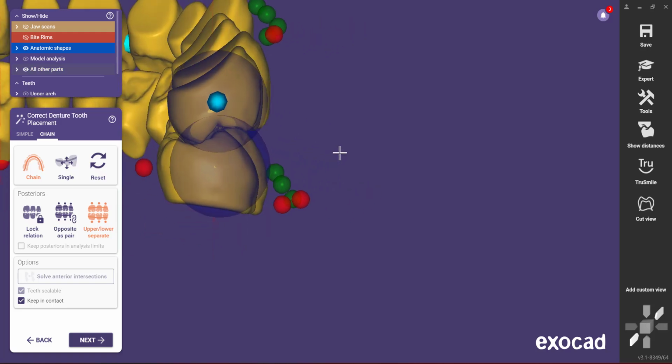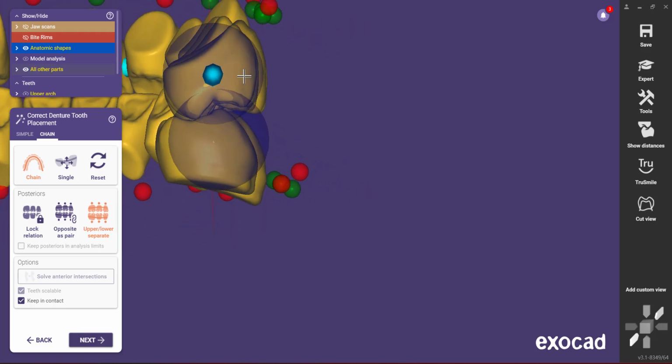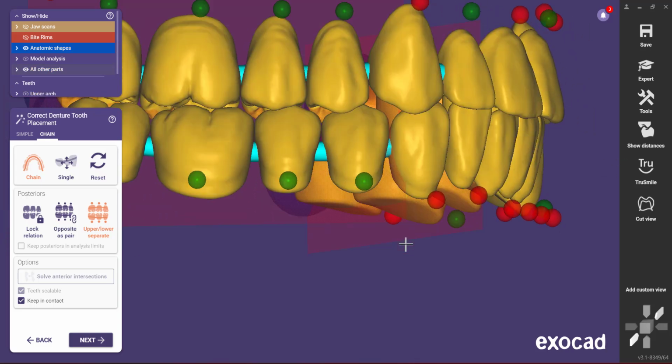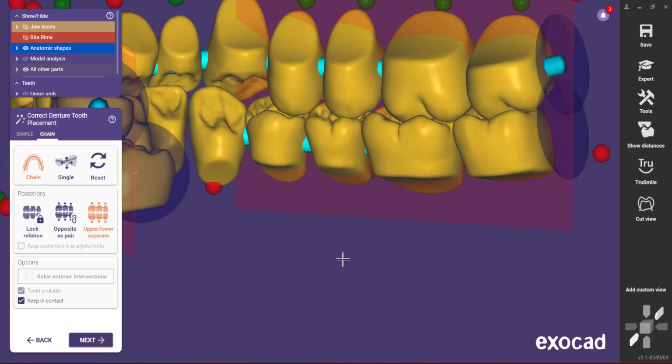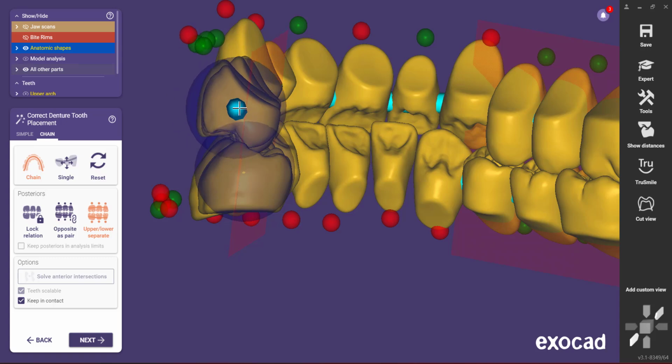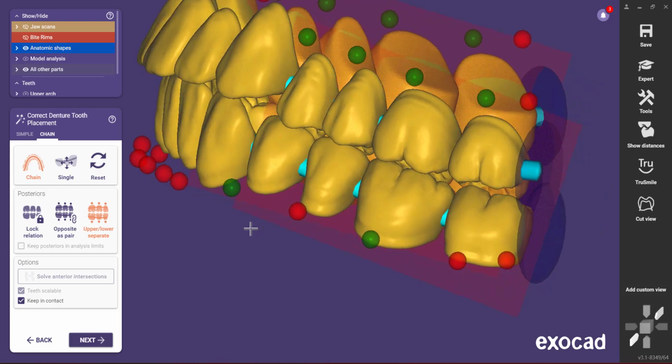So that doesn't look too bad, honestly. Probably come down just a hair right there. This side, obviously, I've pulled in more, so this side is going to have to come in, get those teeth in the fossa.